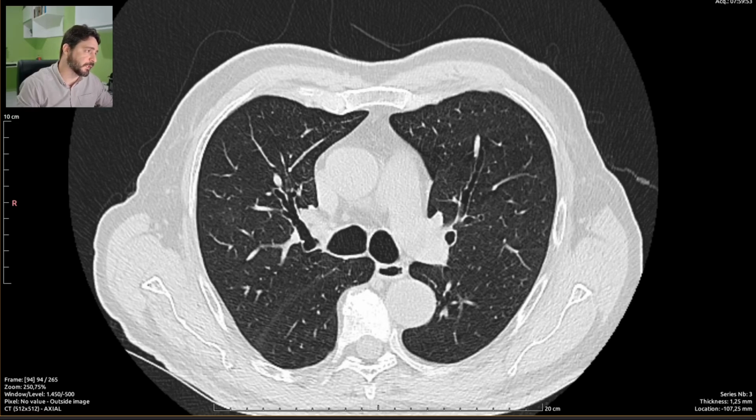I have a template for such cases. This is an elderly patient with a quite normal CT scan of the chest, and also the tortuosity of the aorta should be reported. Atherosclerotic plaques on the coronary arteries, and that is it.